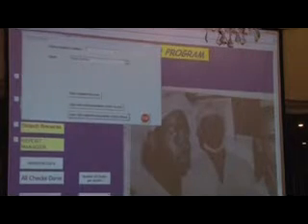Okay, I'll move away from that. Now, I'll show you the one we've done for pacemakers. Now, some procedures require specific types of databases. So for pacemakers, mainly because the type of information is very specific, it is a different type of database. So demographics, the implant data, various complications, allows us to see what implants have been done, and we can also use it to search the records for any one particular patient and pull that patient's records up, both for the implants and for the postoperative pacemaker checks.